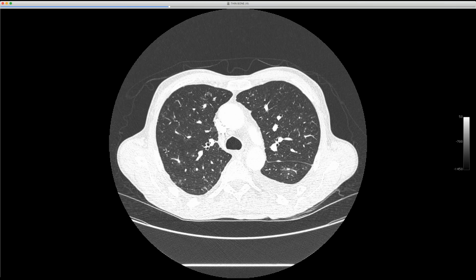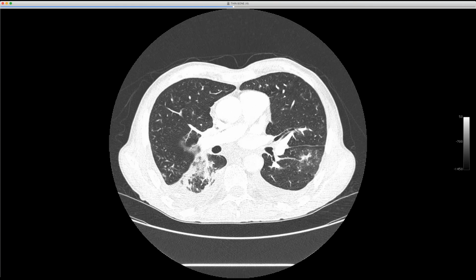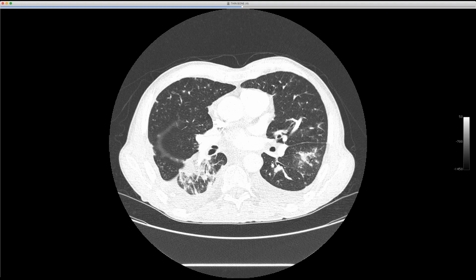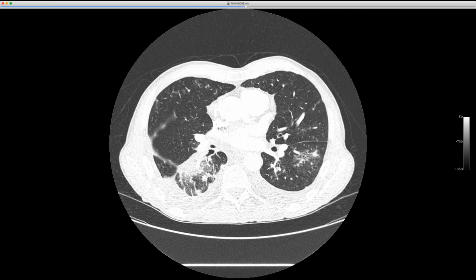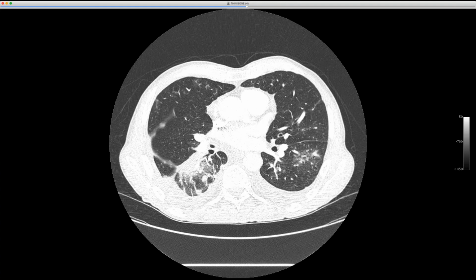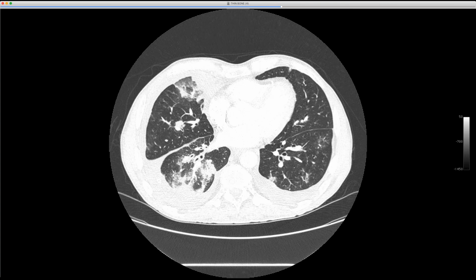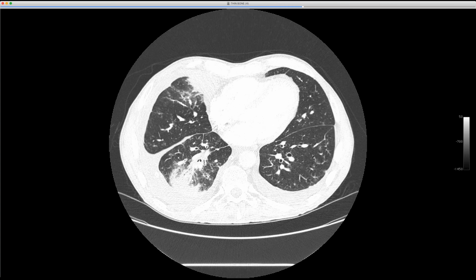And you see a lot of these. We see some larger discrete nodules, but I think these are engorged veins from tumor involved in them. I think these are endovascular metastases, but unlike the arterial tree-in-bud metastases like you can see with a renal cell, which I have a case, maybe I'll try to have it for next week to show the contrast.